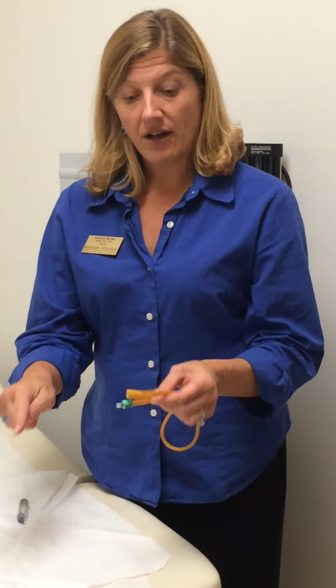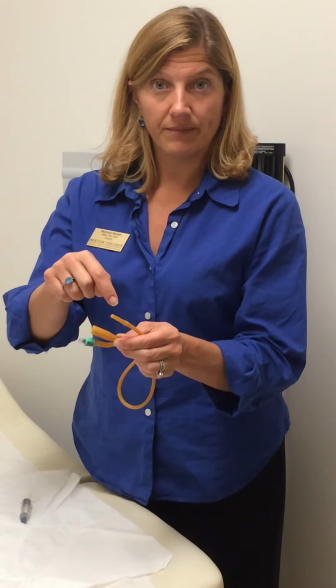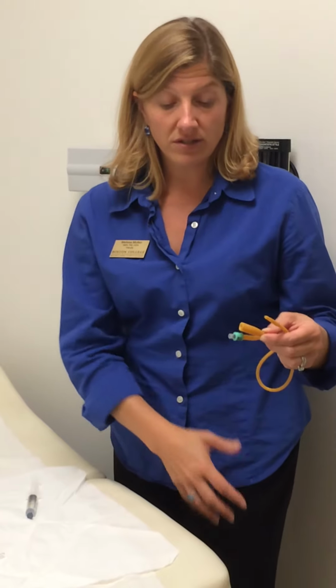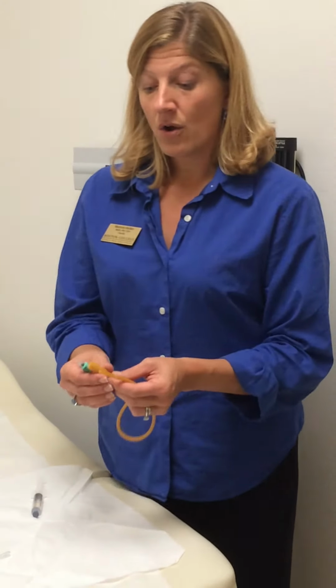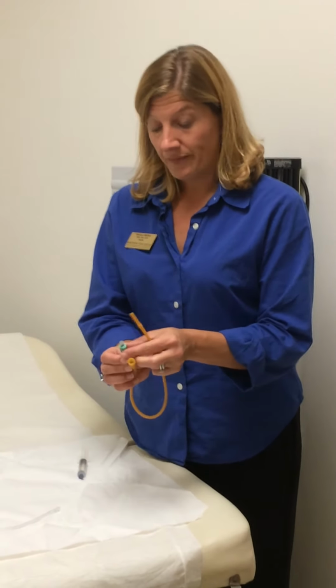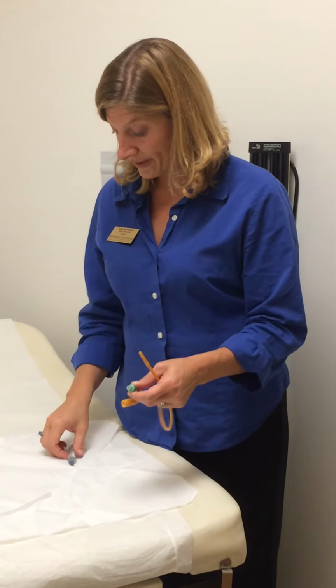Urine will come right back out of it after going through the holes at the tip, coming down the tube and out. And we will hook it up either to a leg bag for the patient, a larger collection bag that you would hang on the side of the bed, or to a specimen container. The second port is what we use to inflate a balloon so that it stays securely in the bladder.